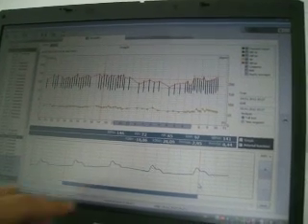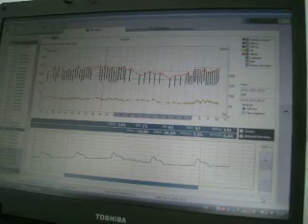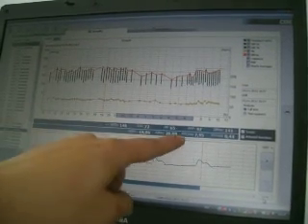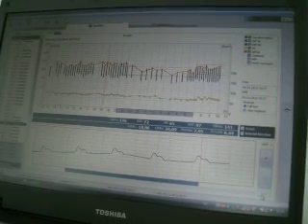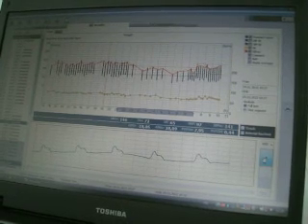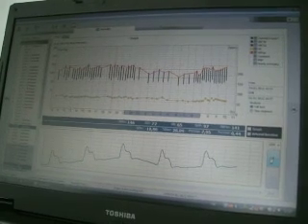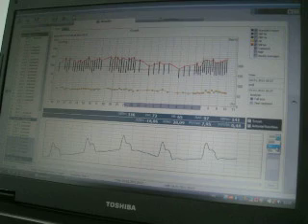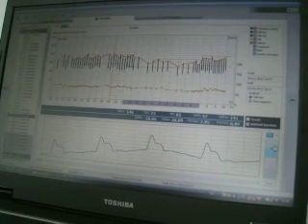If you like it more than the whole, just press save here, and your manually chosen numbers will be saved into the database for later evaluation. You can magnify these waves just for better visibility, and you can magnify the horizontal axis either. So there are plenty of options here.